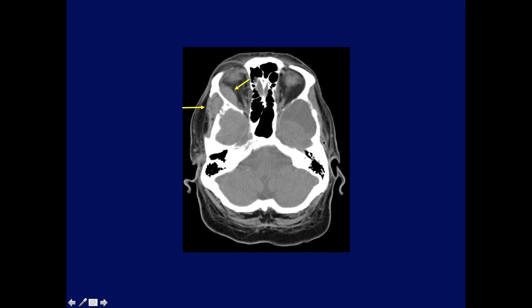What is this pseudomeningioma? With possibly other conditions? Any diseases anybody wants to mention? Lymphoma, not bad. Multiple myeloma, Gino mentioned, and Anshu mentioned lymphoma, all very good diagnoses. I don't think you can tell. But as Gino said, this was a multiple myeloma.